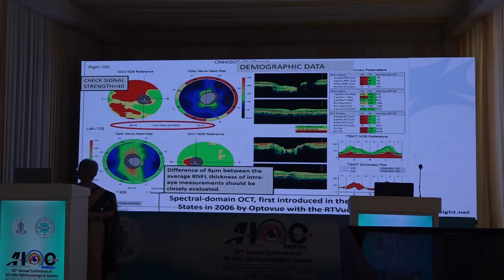Now, once you have seen that, please don't forget that it is comparing from the very beginning. Here, the hot and the cold colors are not coming in, so that's a disadvantage. But now the immediate analysis goes in. I want you to concentrate definitely on this area. This area is the one that is giving you every parameter. How big is your disc?